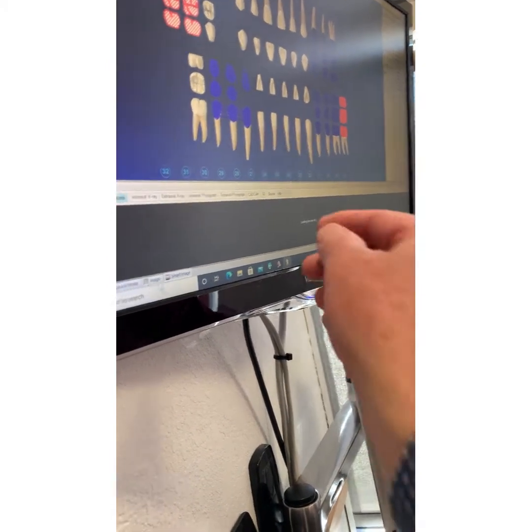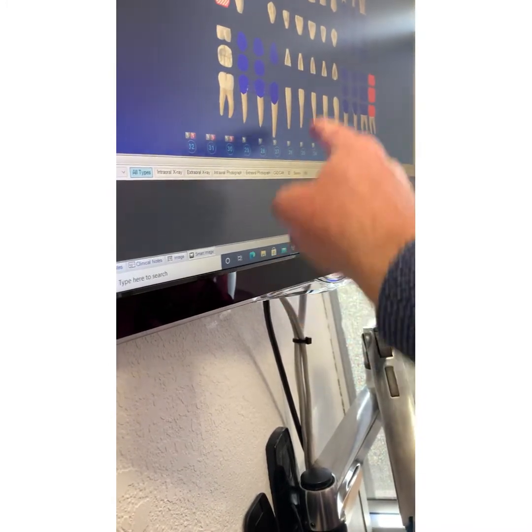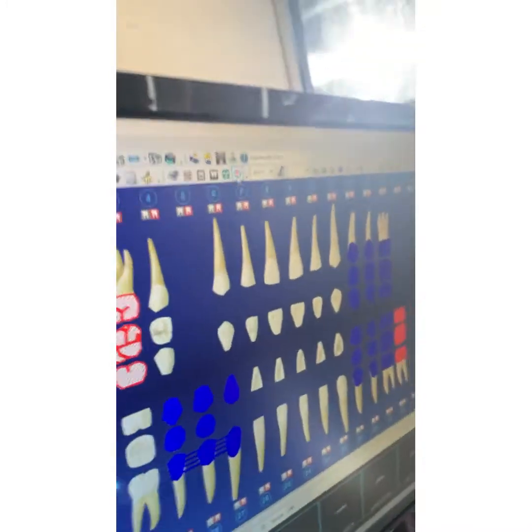Is it at the bottom of there? Smart image? Let's go to... Ah, there it is right there. Let me see what it looks like. Little R. That's the top. So you click on launch. Okay. Just hit okay. Okay, you should all need okay. All right.